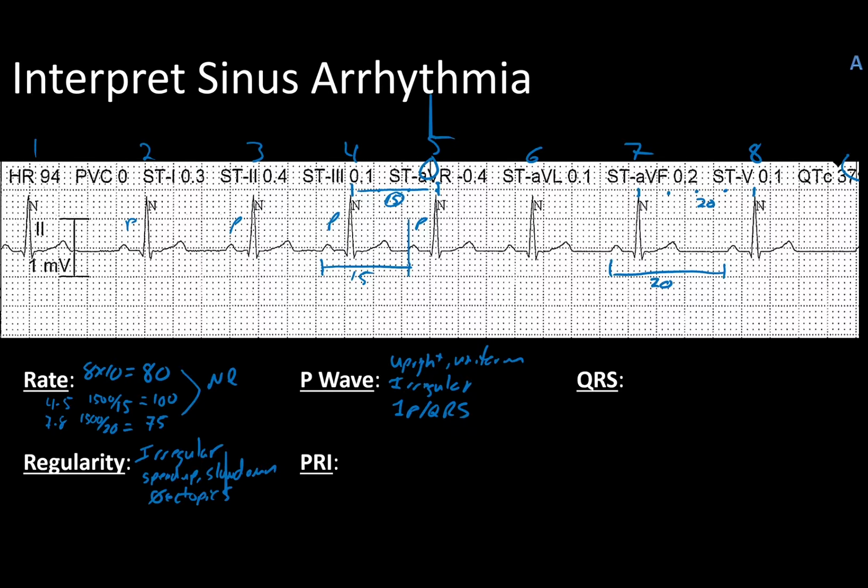Let's grab a PRI. Let's go ahead and measure one out here to the side. And so I've got 1, 2, 3, 4. I'll measure one more way out here. Let's go ahead and pick this one. We'll say it's about a half mark. Actually, I'll say that one's on the solid. 1, 2, 3, 4. Again.